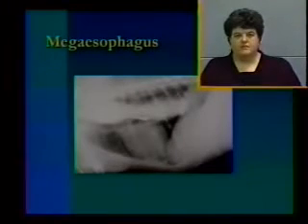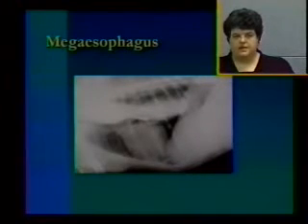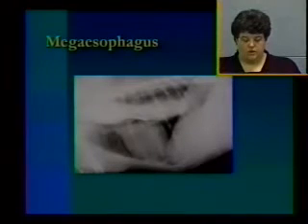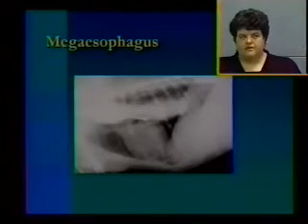Just to remind you, one of the common mediastinal abnormalities is a megaesophagus. The radiographic changes you'll see in an animal that has not been administered barium includes a tracheal stripe sign, where you can actually see both margins of the trachea. You can actually see the thin walls of the air-outlined esophagus in the caudal thorax. And as in this case, if you're suspicious, what you can do is go ahead and feed them a barium meal and identify that the esophagus is in fact distended.